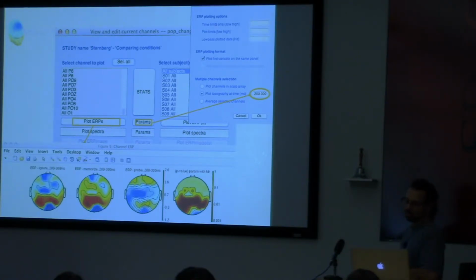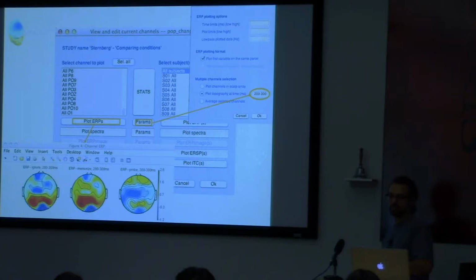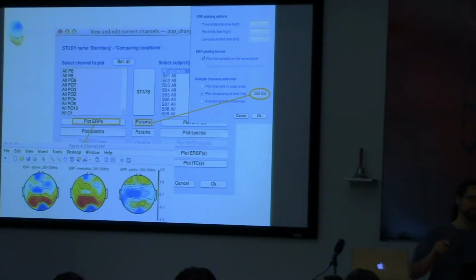So all of this here was because people thought, well, that's a little bit involved. I just want to click simple ERP. So the simple ERP does everything for you. It finds your file, it assigns your condition, it pre-computes, and it does the plotting. But you can do it this alternative way. The other advantage is that you can compute other measures.